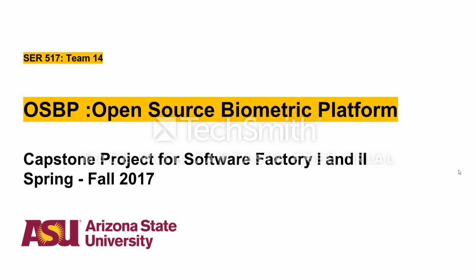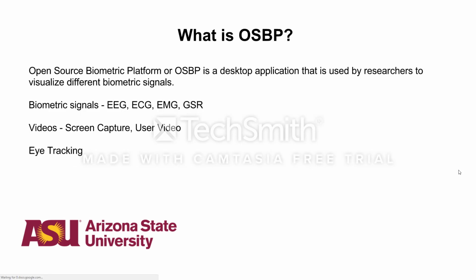Hi, I'm Tushar and I'll walk you through our application, which is the open source biometric platform. So now what is OSBP? Open source biometric platform, or OSBP, is a desktop based application that is used by researchers to visualize different biometric signals and another parameter called eye tracking.